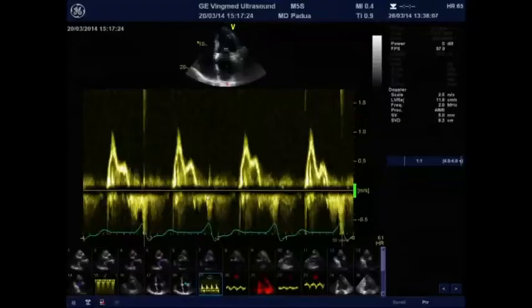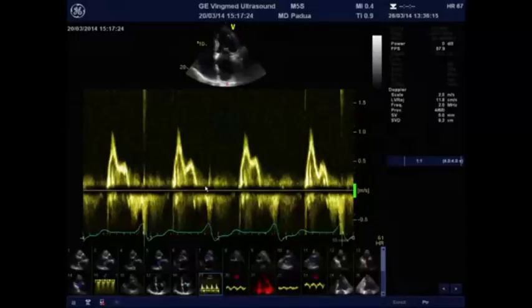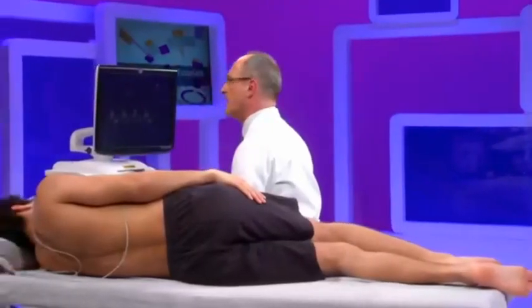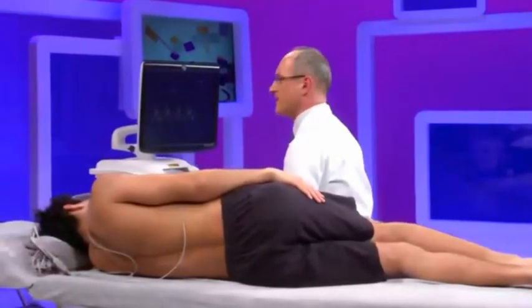Some studies have shown a high sensitivity of the changes in the filling pattern of the left ventricle to detect acute rejection of the transplanted heart, but this has not been confirmed. They are too load dependent. However, it's very important to detect them.